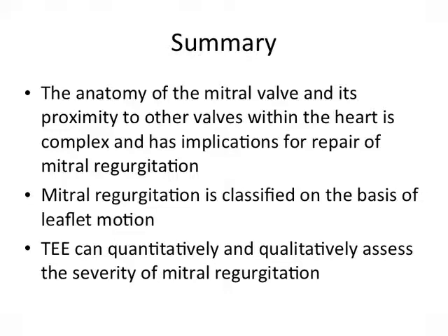In summary, the anatomy of the mitral valve and its proximity to other valves within the heart is complex, and this has implications for repair of mitral regurgitation. Mitral regurgitation is classified on the basis of leaflet motion. TEE can quantitatively and qualitatively assess the severity of mitral regurgitation.